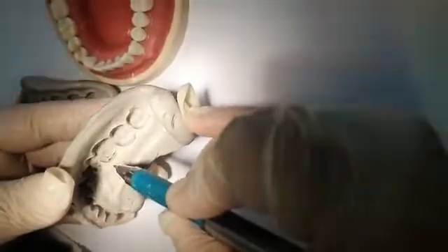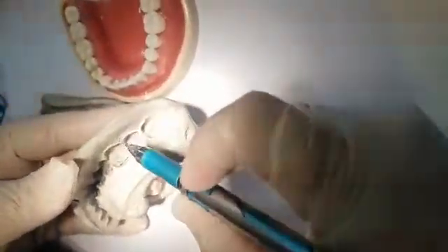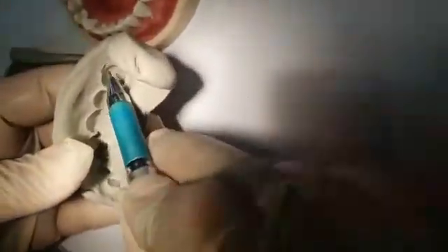Drags happen in all impression materials, even in alginate, where the impression material is not taking full anatomy around the teeth or finish lines or around occlusion, whatever. So we have a drag. This is one of the areas of drag. This is an area of deficiency. Here it's a bubble, but here it's a drag. See how it's dragged away?